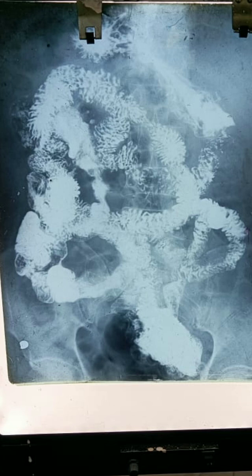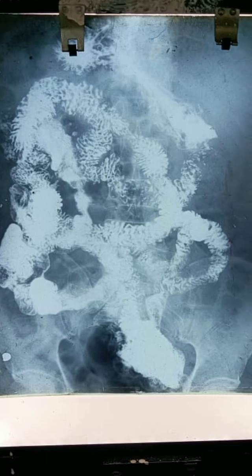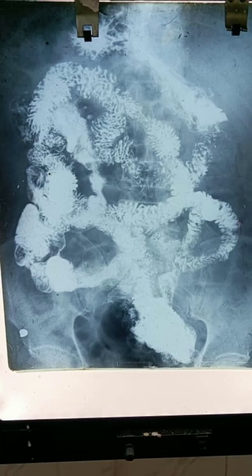So if somebody asks me to read this radiograph, I will tell it is a contrast radiograph of the abdominal region, AP view, that is anterior posterior view of the abdomen, showing the contrast dye here is barium sulfate, and the organ seen is small intestine. We can see the coils of small intestine starting from duodenum in the upper part, followed by jejunum, and in the lower part, the smaller tubular portions are the ileum. So this is a contrast radiograph to show small intestine, and it is termed as barium follow through.